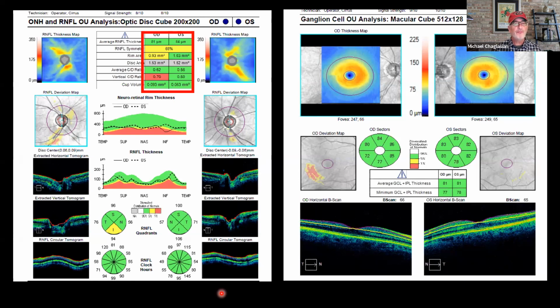But here again, if you can't see the data, if you can't read it, if you can't line it up, if you can't flip back and forth between the OCT, the visual field, the optic disc photograph, you're putting yourself at a disadvantage. Even before we get into the mechanics of dissecting an OCT report, you need to be able to see the information.